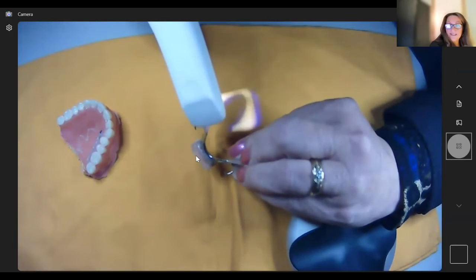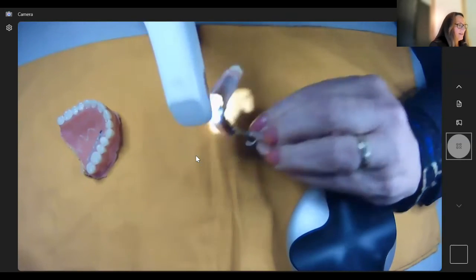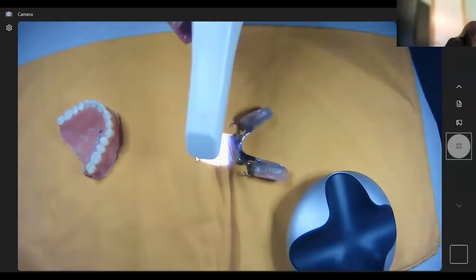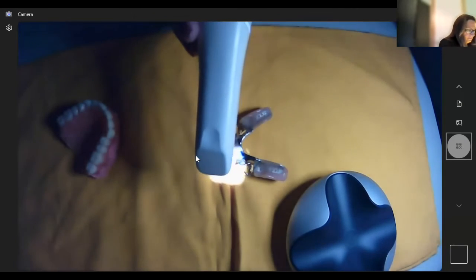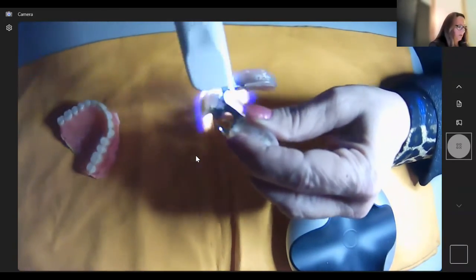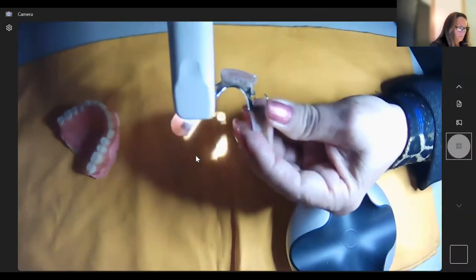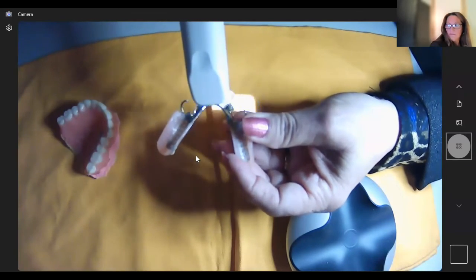And just like I always say, when you're scanning, turn off the overhead lights. Having 2 camera lights on, take that off right now, because that's too bright for it. Okay.